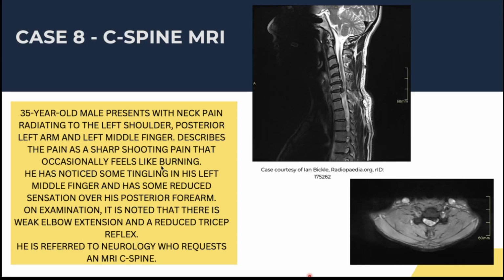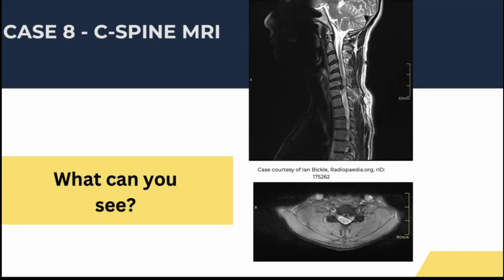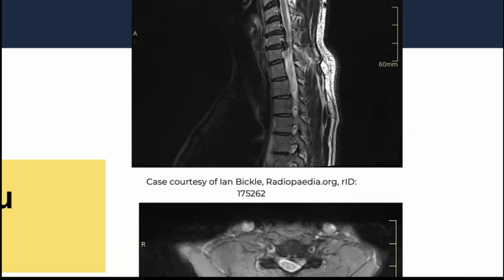So this might take a little bit of digging from our myotomes and our dermatomes to try and figure out what's going on. So what can you see? This might be the better way of doing it because you can see sort of both. So if you were looking at these MRIs, and again, you can use the alignment lines of the vertebrae to see if there's any malalignment, might help. Give you a minute, you can pop it in the chat or pop your mic on.